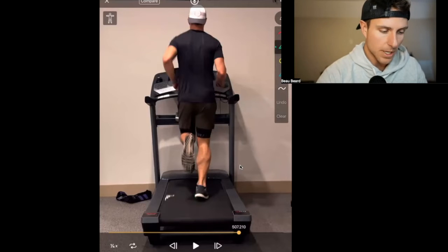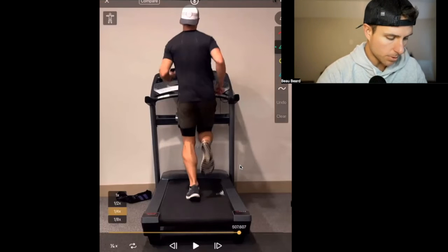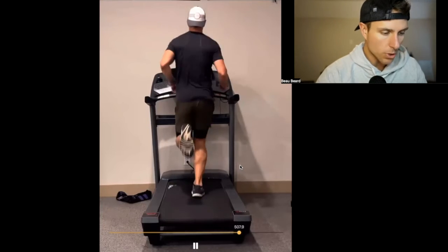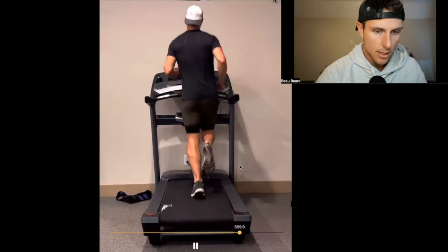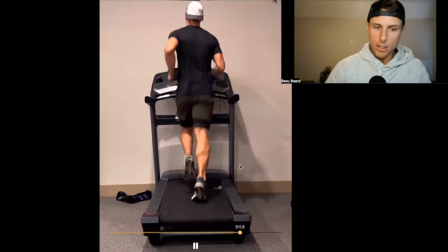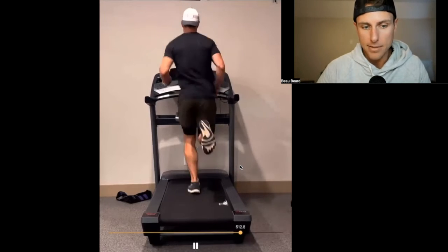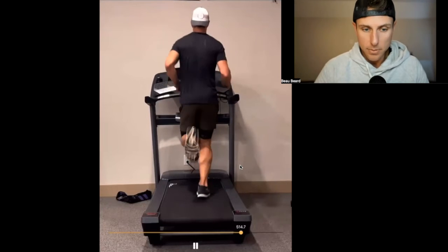Now let's look at my feet. That would be the next thing. Well, let's play it out for a few strides here. We'll speed it up a little bit. We're going to look at torso rotation. I'd say I do a pretty decent job bilaterally. But yeah, it's almost like I'm throwing my left hip underneath the middle of my mass to maybe make up for some perceived instability, some actual instability.